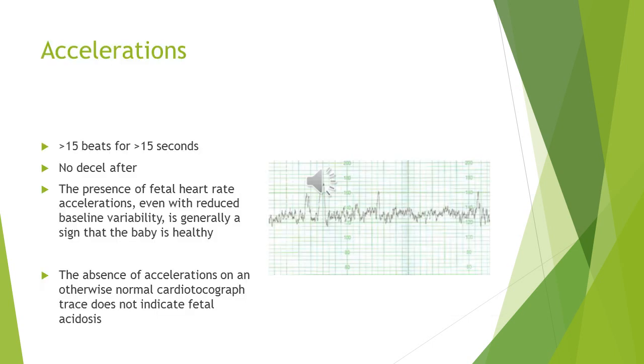Accelerations are any increase in the fetal heart rate of more than 15 beats per minute for more than 15 seconds. So for an acceleration to be an acceleration, it should be more than 15 beats per minute for a period of more than 15 seconds and no deceleration after that. Presence of acceleration, even with reduced variability, is a sign the baby is healthy.